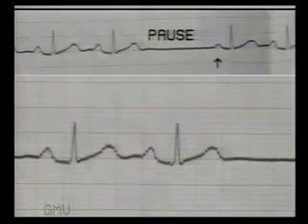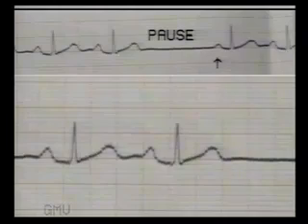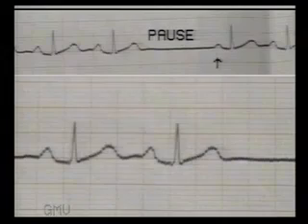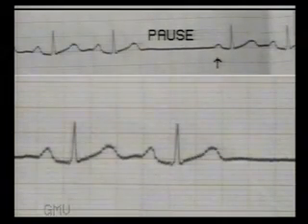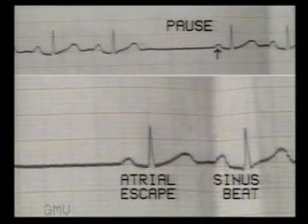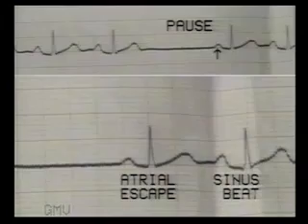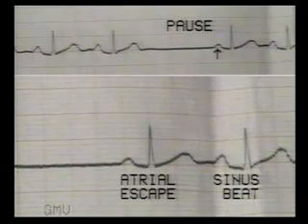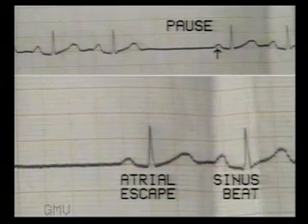This ECG shows a pause. The preceding beat is not premature. Preceding T wave is normal. So this is a sinus pause. So now we study the succeeding beat. It has a normal QRS configuration, but the P wave is slightly smaller than other P waves. So this is an atrial escape beat. Note that the next beat again shows return of sinus rhythm as the P wave is normal again. So this is a sinus pause with an atrial escape beat.